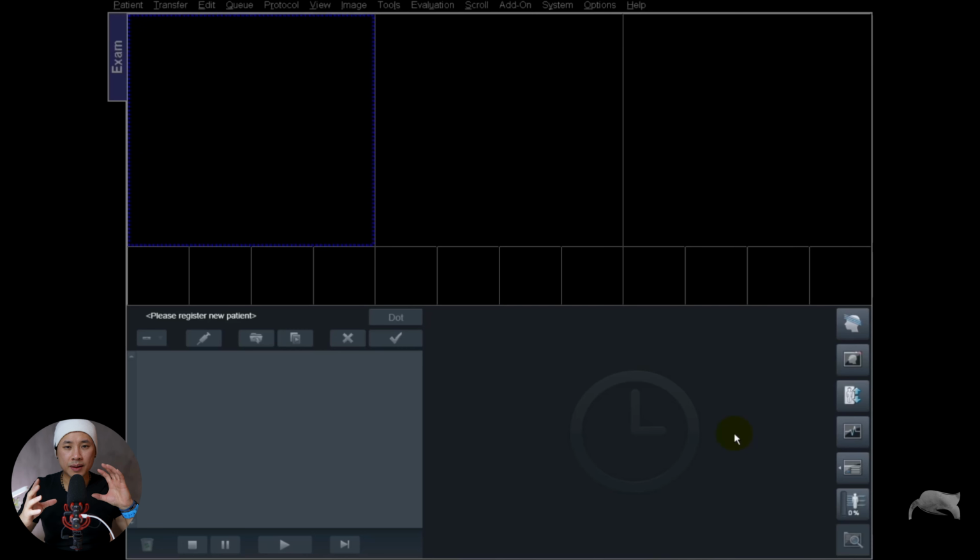Not like automatic planning, but automatic shimming and pop up, pop down. So you avoid a lot of clicking here and there, drag and drop of sequences. Everything is more automatic. It's easy for you to focus on the protocol, focus on how you can do cardiac instead of focusing on a lot of keyboarding.